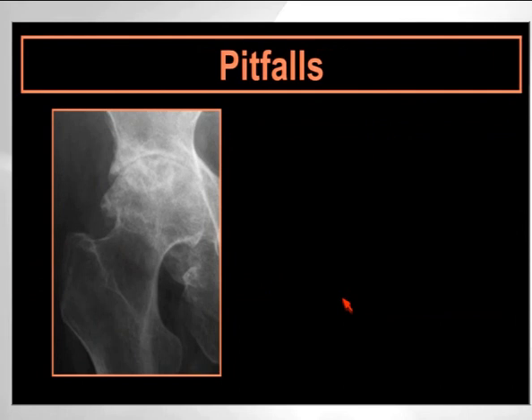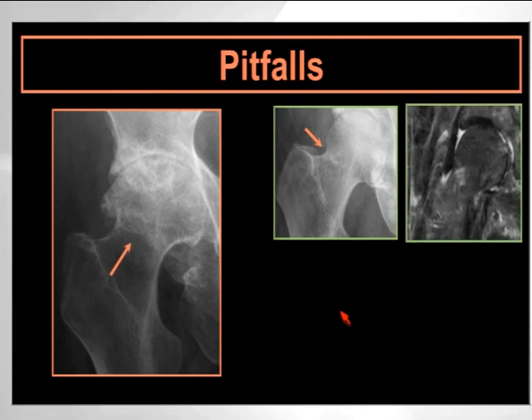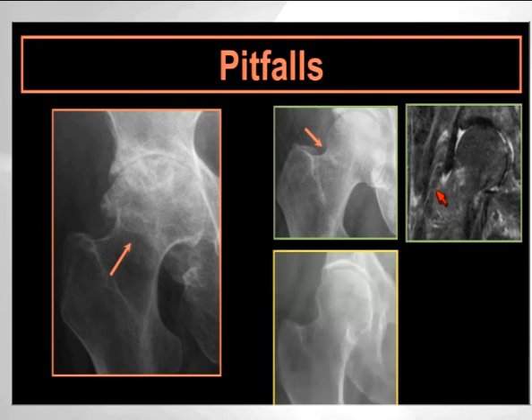This shouldn't be a problem because we are looking at significant osteoarthritis with a femoral neck ring of osteophytes mimicking fracture. And unlike our impacted fracture, there is significant joint space narrowing. This was a case I actually overcalled. I thought this was a fracture, but there was no history, there was no concern. An MRI was done, and this was just a sclerotic lesion. The patient had extensive metastatic disease, and this was just a lesion.